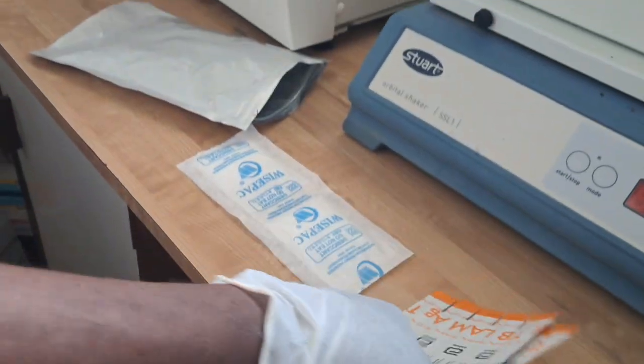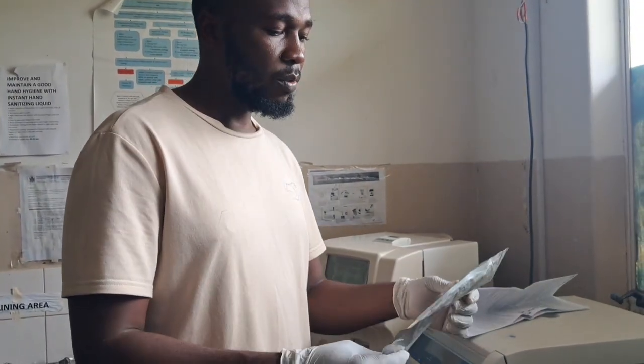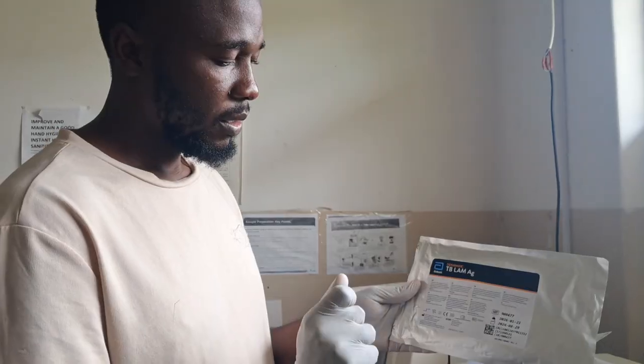So before we go to the testing procedures, we have to know first how to keep these test kits to avoid false positives and false negatives. So these test kits have to be stored at a certain temperature. It's on the pack. So you can store them at 2 to 30 degrees.